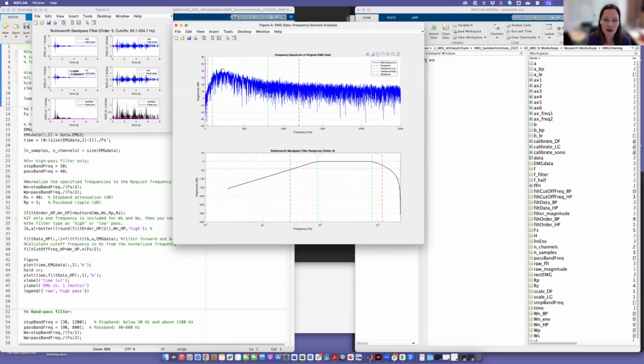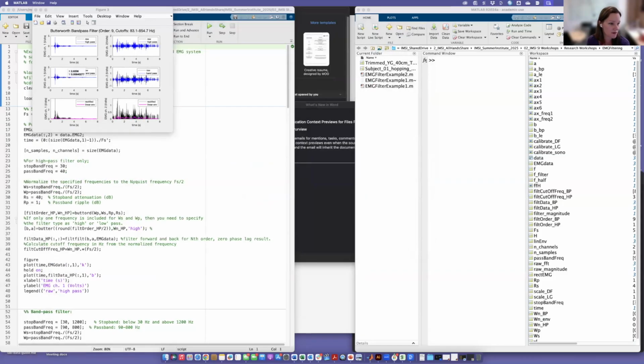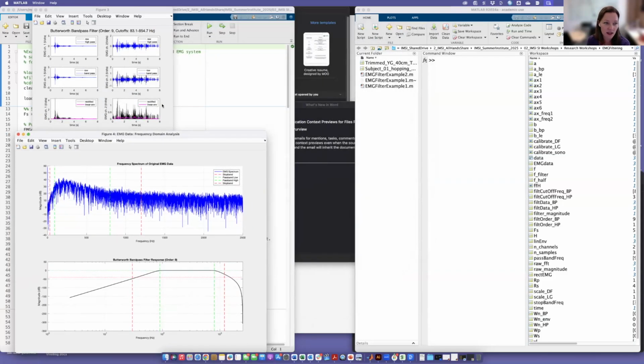Here we have magnitude 40 up here. Once we get to around 0, there's nothing really there of note in terms of magnitude. So if you have more complex data, it might be useful to set this one aside for now and go look at the other data set for comparison.